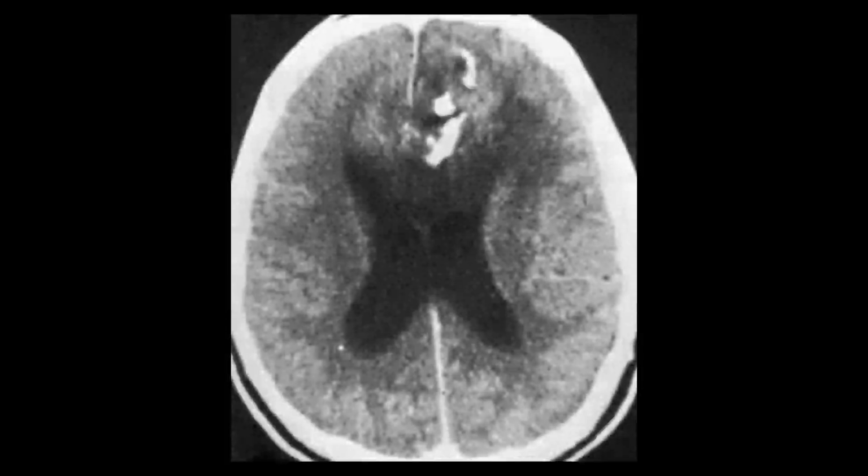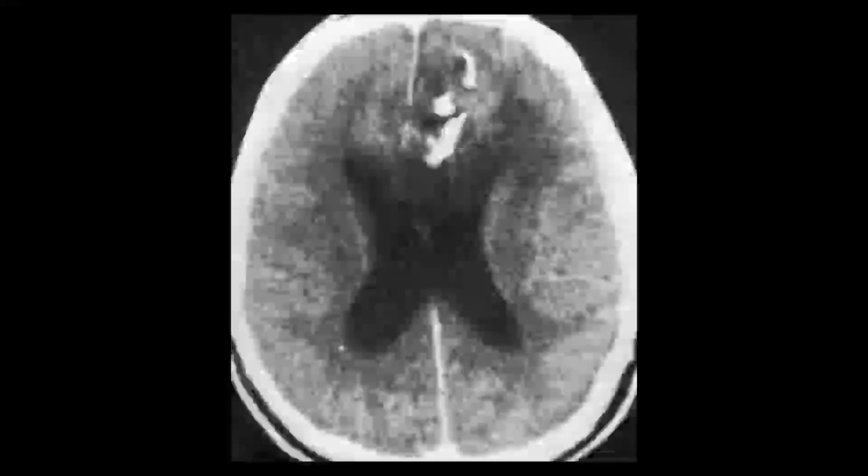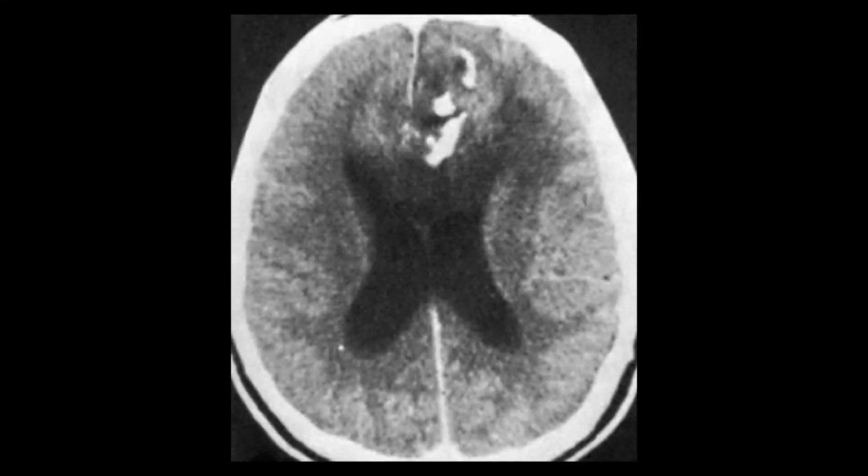Another example of oligodendroglioma, you can appreciate it is involving the cortical part, it is involving the frontal lobe, and in 90% you can see the calcification. Here you can appreciate the calcification. It happens to be hypodense in nature, and it has also caused midline shift. Besides this, on the image you can also appreciate hydrocephalus, which is not likely due to the oligodendroglioma, because that is far from the hydrocephalus.